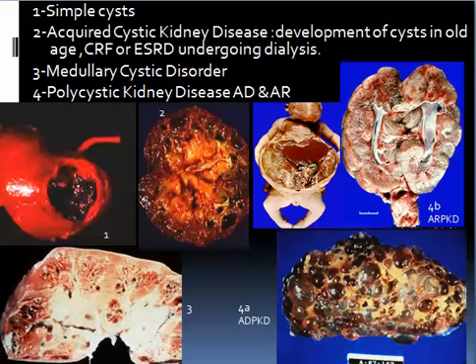The difference is that the cysts are along the proximal renal tubules and the proximal collecting system, while here myriads of cysts are seen involving the junctional area between excretory and collecting renal tubules.